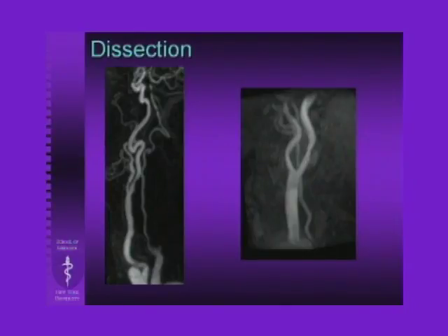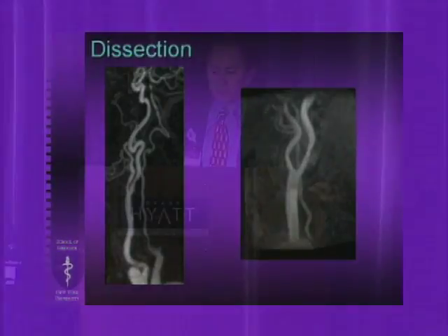So it's one of those things that I always put in the report just to alert them that this situation exists. Sometimes, if you look at the way the vessel is kinked, you really could believe that it's a flow-restricting lesion. It almost looks like a garden hose that's been folded back so tightly on itself that you wonder how blood is flowing through. And that actually might be, in the future, a use of looking at flow quantification, which we can do in MR as well, to see if there's a flow-restricting lesion there.